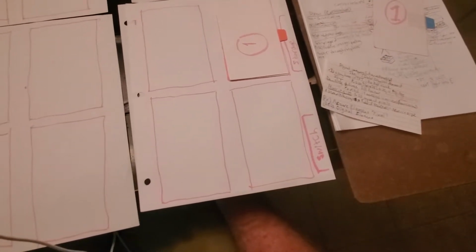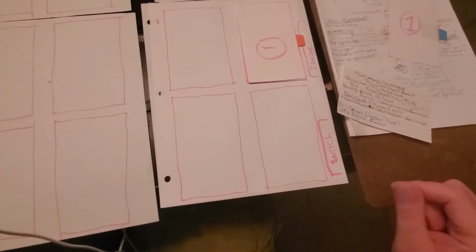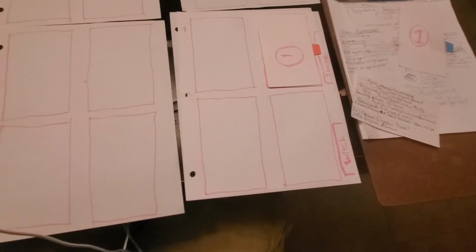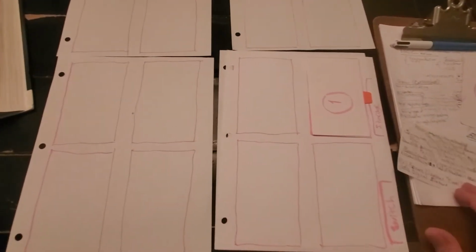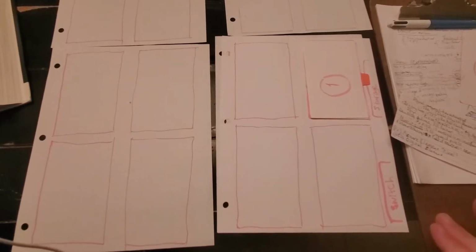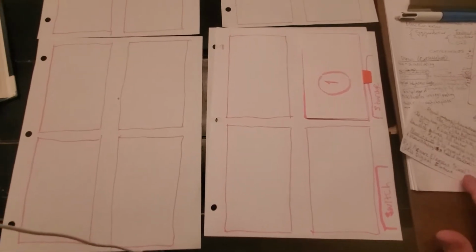So the pixel pitch is measured in microns. A micron, to give you an idea, is 0.001 millimeter. Now, the matrix size, or the size of the whole thing, is going to be a 2D array of pixels, and that's all of this together.